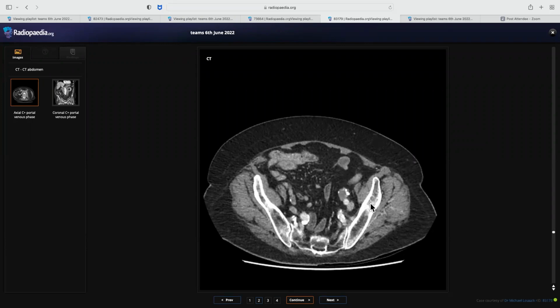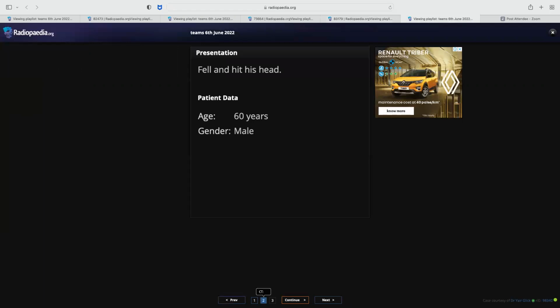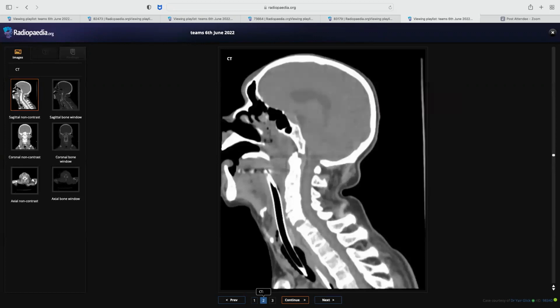Of course. Otherwise, I will tell you, you told this case very well. This abdominal aortic aneurysm rupture, you told even on the radiograph, that was really nice, and very quickly you told it, without any further discussion. You want to see another case? No problem. Yeah, I may cancel my exam for 6 months, so please give me one more. That's the next case.